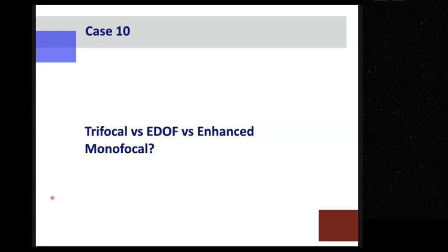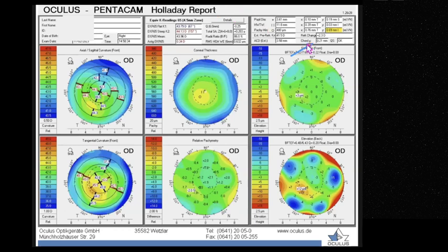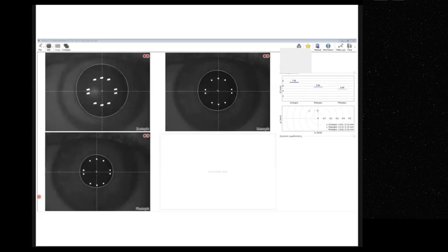As we said, we have to look at two things. The RMS is high here, and chord mu is normal here. And of course, the pupil size. Always take the average of the mesopic and scotopic. Take the average of them and check. If it is 7 millimeters and above, the patient will never be happy with a trifocal. Will never be happy with a trifocal.